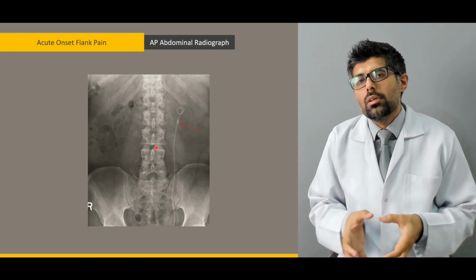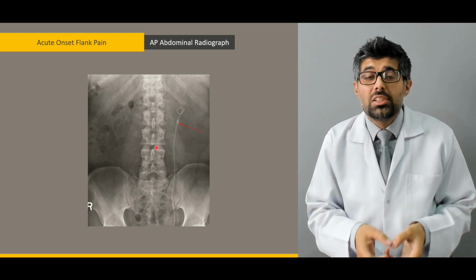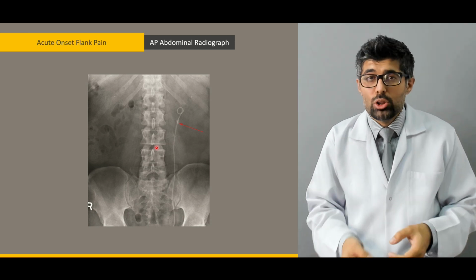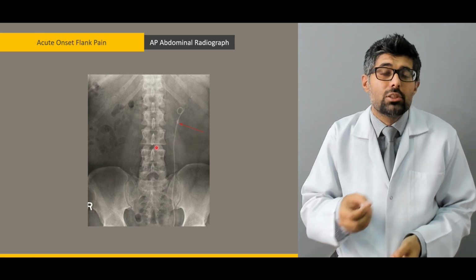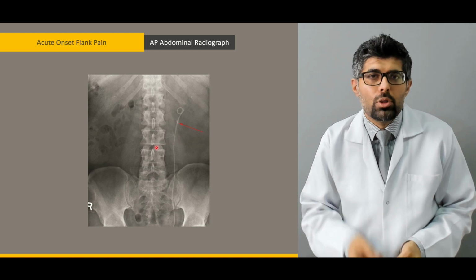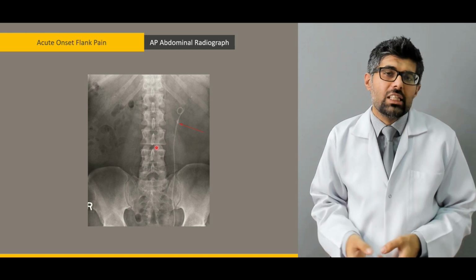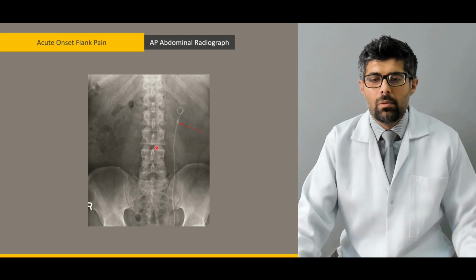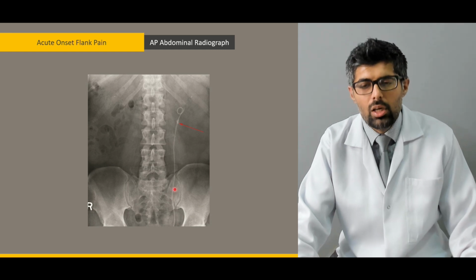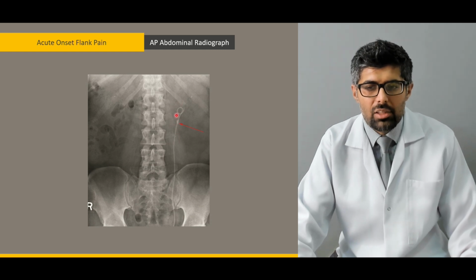Now, if a renal calculus is not present inside the pelvis of the kidney where it is formed, but instead has lodged inside the ureter and has not impacted, one of the most common procedures that can be performed to eliminate it is the insertion of a DJ stent. Now, DJ stands for double J stents. Here you can appreciate that the stent has been placed through the urethra into the urinary bladder, then the ureter, and then inside the pelvis.